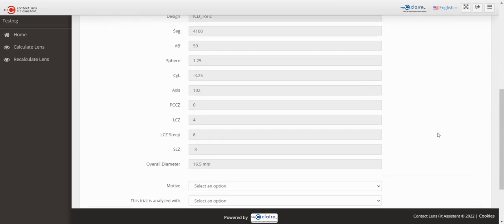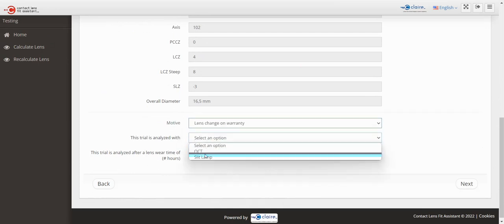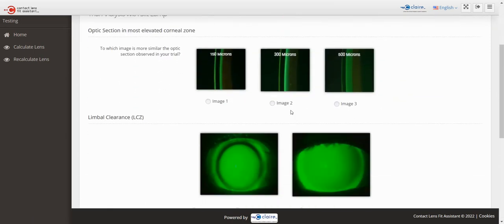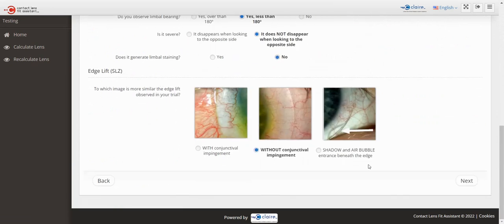As you can see, through this tool, eye care professionals will get technical support over all the lenses the patient might need and will benefit from an important reduction of lens changes. Hope this video has helped you to clearly understand the high potential of providing virtual technical support to eye care professionals, who will be able to manage by themselves the vast majority of troubleshooting challenges.